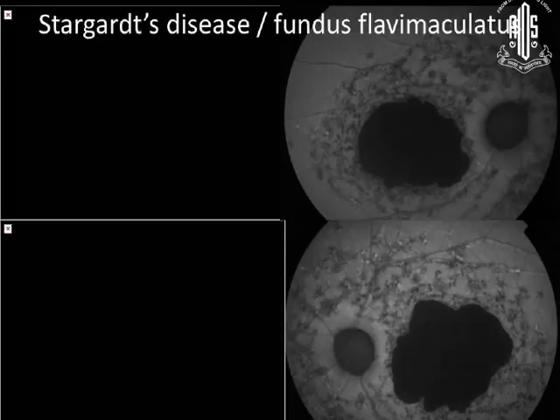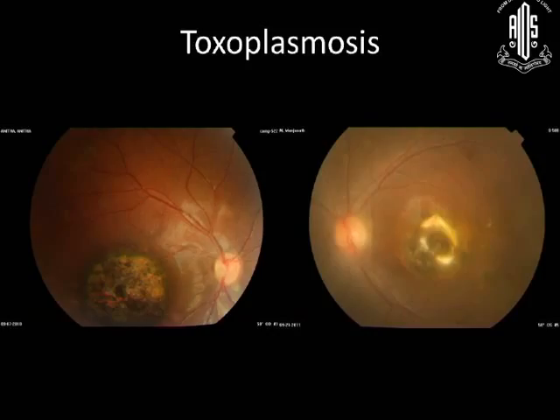So Stargardt's disease can present like this. It can present like a macular scar, but not all macular scar is Stargardt disease. The children can present like this also, what appears like a macular scar, but usually it's unilateral. So what you're looking at is toxoplasmosis. It can present as a macular scar, but usually unilateral.